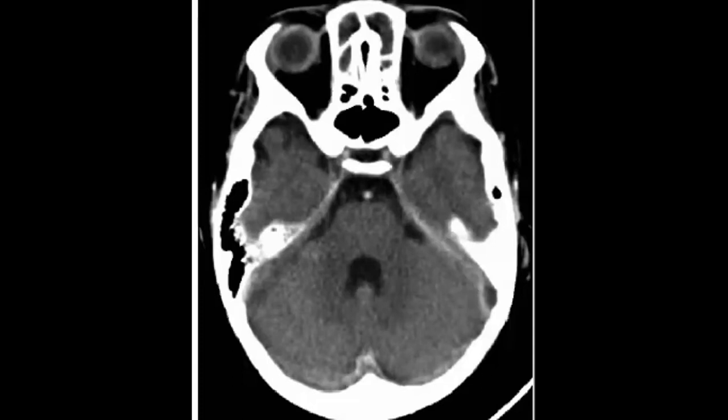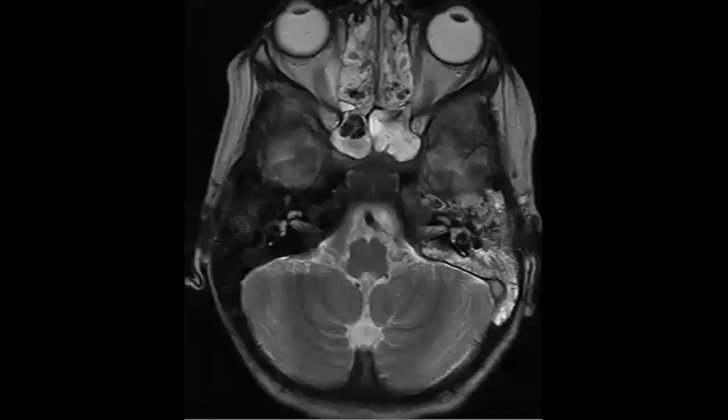So do you like to shift to MRI, or are you still on this? Yes. Okay. So let's go to the MRI. I will show you the MRI, and we can make a nice description together until we reach the best diagnosis. So what? Rosine, welcome Rosine.